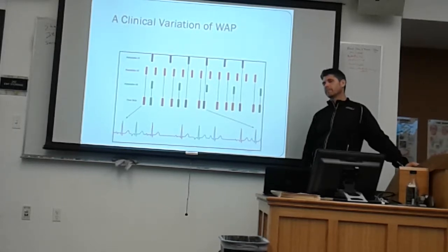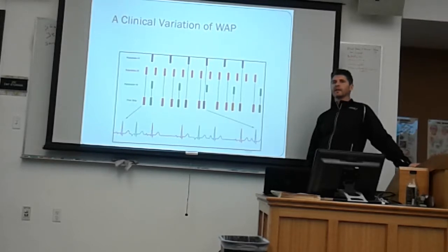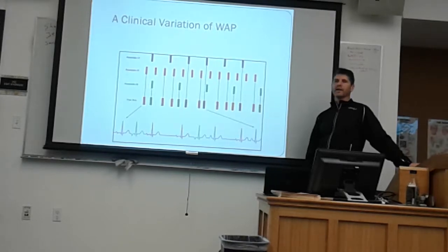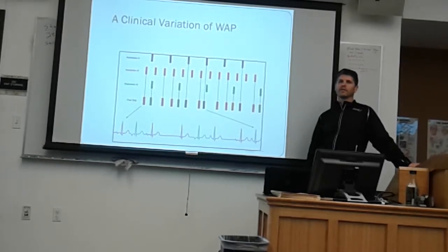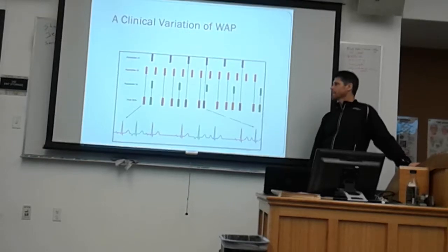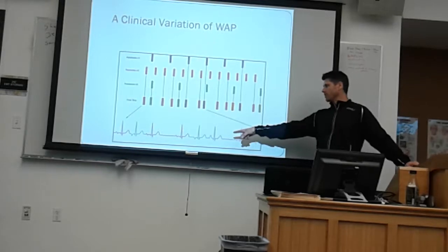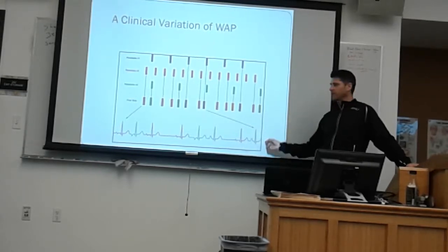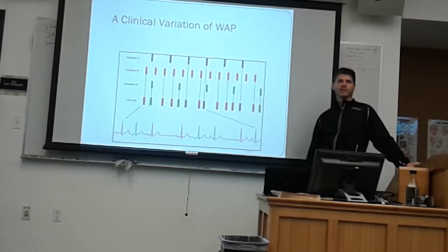Would you consider AFib a version of a wandering atrial pacemaker? No, because AFib does not have a singular pacemaker site that gets control of the entire atrium. AFib has no singular pacemaking site at all, or even several pacemaking sites. It's all of the contractile cells being disrupted. It's not a flutter, either. This is not circular. You don't see any places that don't have baseline. You see baseline all throughout this. So there's no circular continuation going on here.